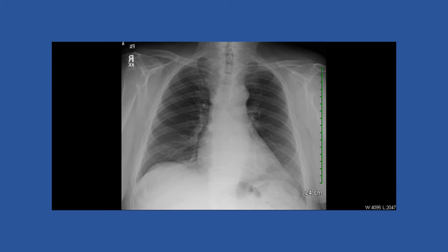You can tell it's a PA because in an AP, just based on the angle of everything, the heart looks much larger than this. The heart looks very oversized on an AP. Always, if you have a stationary x-ray machine, they'll do a PA. APs are really only done with portable machines just because of the practicalities that you really can't get a PA in that situation.